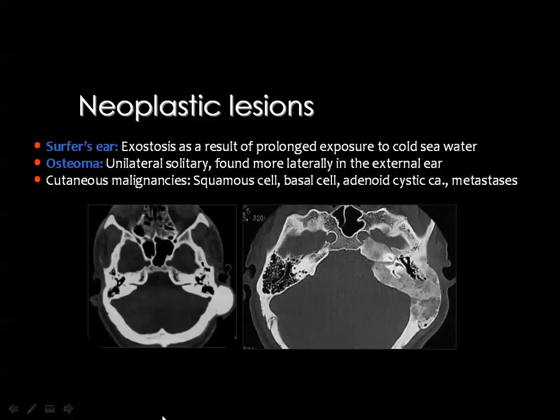Here are two different examples of lesions that can occur near the ear or involving the petrous bone. And this is just an osteoma, or ivory osteoma, which has been discussed in detail in the section on bone tumors. It is an osteoma with no medullary cavity that is frequently seen in the flat bones and usually encountered in the paranasal sinuses as well.